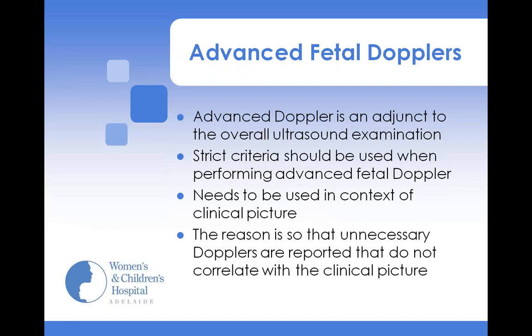Moving on to the main topic of today's presentation, which is the advanced fetal Dopplers. Advanced Dopplers are an adjunct to the overall ultrasound examination, so it's not done as a standalone study. As mentioned before, we use strict criteria, and it needs to be used in the context of a clinical picture.